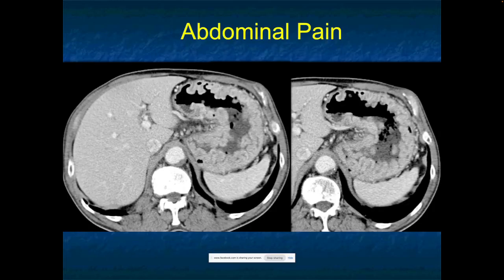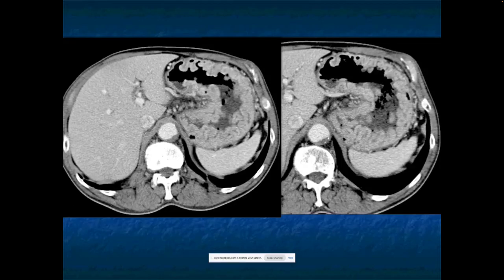Abdominal pain, thickened gastric folds, really, really impressive. You can think about lymphoma, really bad gastritis. You could think about a polyposis syndrome. You could think maybe the patient has a MEN syndrome with a gastrinoma and multiple carcinoids in the patient's stomach. But if I told you those are all good possibilities, but this is benign, there's no malignancy, what else?